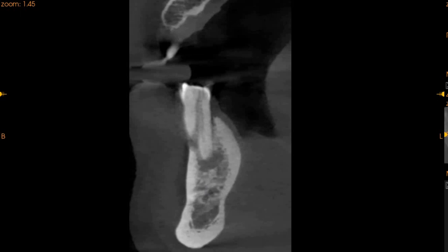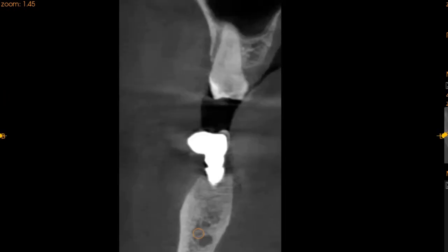underneath the radiolucency. Moving to the implants, the implants are placed quite center of the ridge. We don't see any significant bone loss apically or lingually, just close to the buccal aspect. If we move on to the molar region, the implant again is placed very well in the center of the ridge, and we don't see any significant bone loss around it. Yes, some crestal bone loss can be seen, but not any significant bone loss.